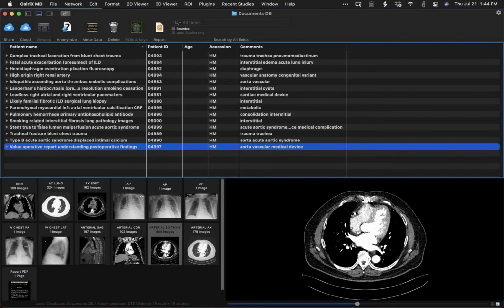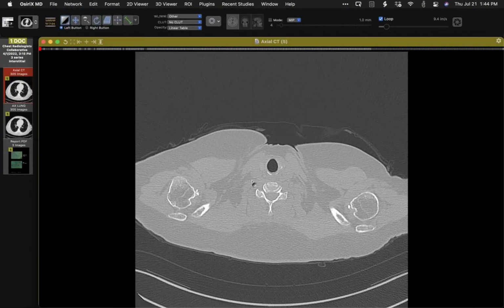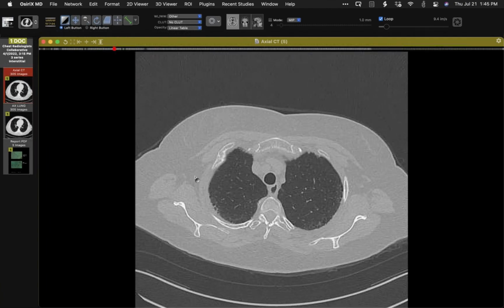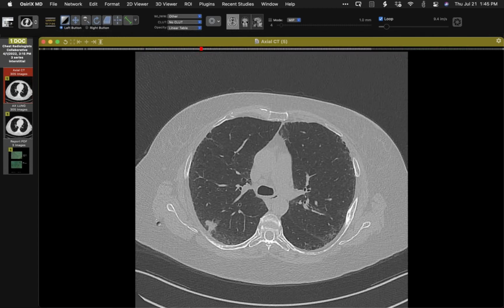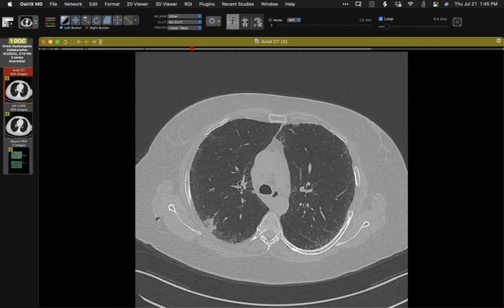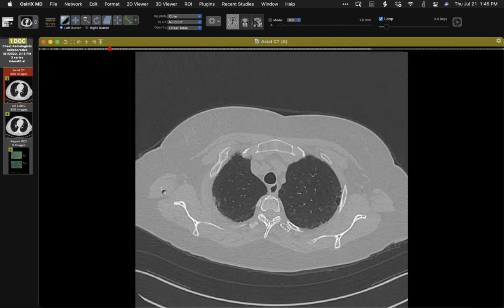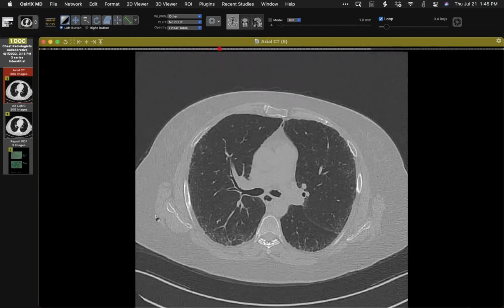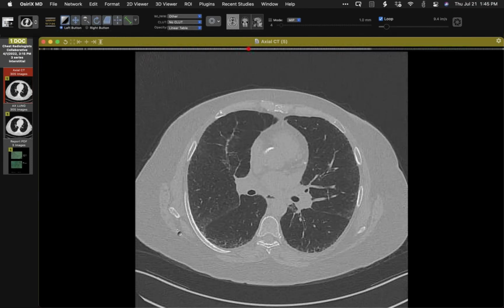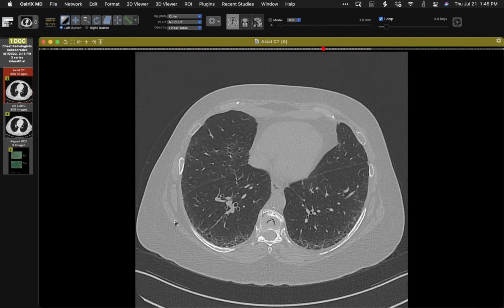Okay, let me show you this one, which is quite nice. This is a patient who has a lung cancer, which is there, and had a right upper lobectomy for that. And if you look at the lungs, you can see the lungs are pretty abnormal. How would one describe that? So knowing that and reading the op report and then the pathology report, I said, oh, this is a great opportunity to get some rad path correlation.